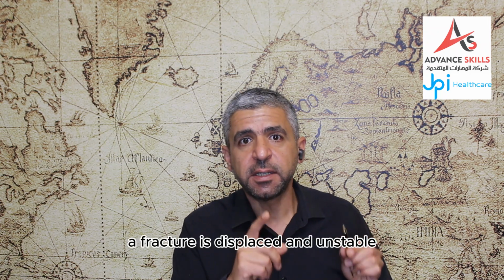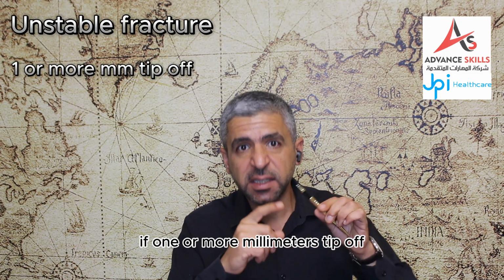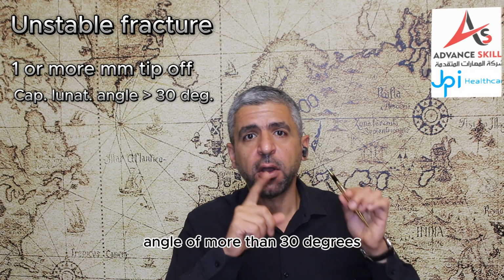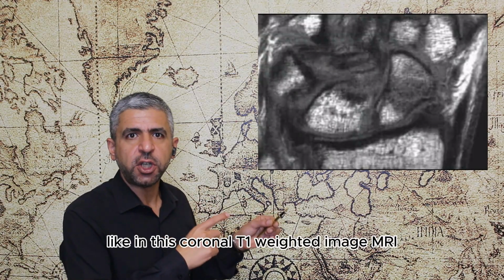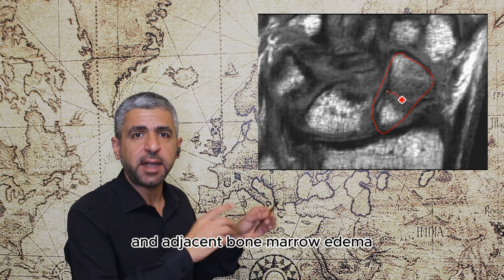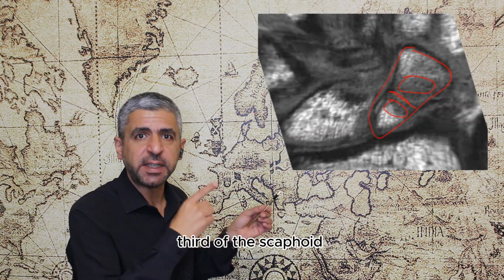A fracture is displaced and unstable if there is a step-off of 1 or more millimeters or an increased capitolunate angle of more than 30 degrees. Like in this coronal T1 weighted MRI, in which we can see a hypointense fracture line and adjacent bone marrow edema in a fracture of the middle third of the scaphoid.